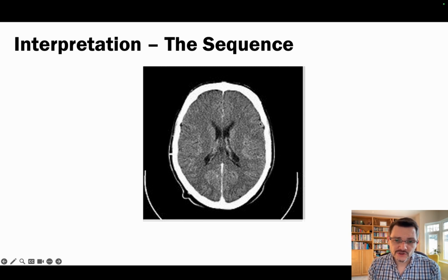But one thing I wanted to draw your attention to is if you look here, if you follow the cursor, you'll see that there's a very thin line on the outside here. There's a little white line, and that's the cortex of the brain tissue. So that's where you would expect all of the higher density neurons to be. That's where a lot of cortical function is preserved, so language, calculation. In your subcortical area, a lot more motor control and transmission of signals. So what you're looking for is a nice healthy border on the outside here, and this all looks appropriate in this individual. And the thalamus here, which is posteriorly supplied from a blood supply perspective, all seems to be intact on both sides as well.